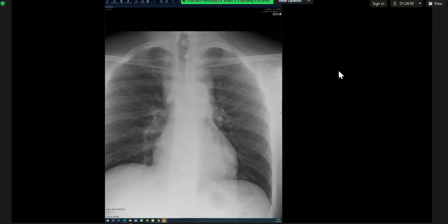Those are the kind of points you needed to talk about. The margins. You needed to talk about how it extends or doesn't extend up. You needed to talk about whether you can see the paravertebral lines or not. You needed to talk about whether you see bone destruction of the vertebra or not. It could easily be a schwannoma. It could easily be an expansile sternal lesion. You didn't talk about those things. So that's what I meant with maximizing.